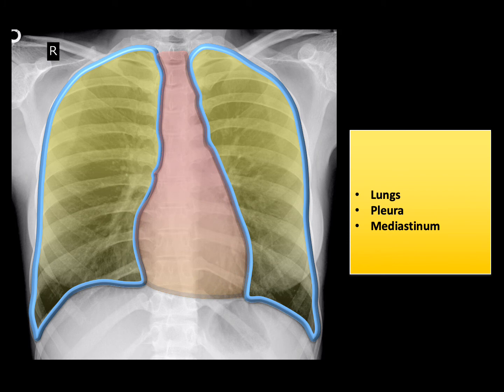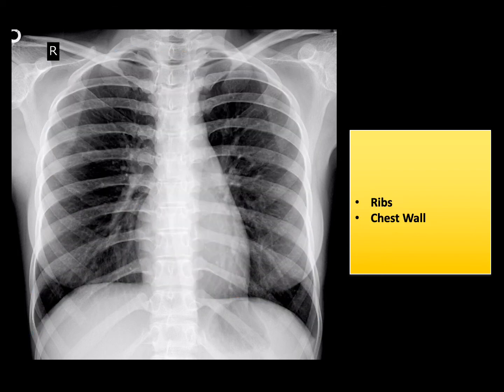Now some people do consider the heart as a part of the mediastinum, and just for the purpose of description, we will do the same over here. So you have seen the lungs, you've seen the mediastinum. So how do we look at the chest wall?